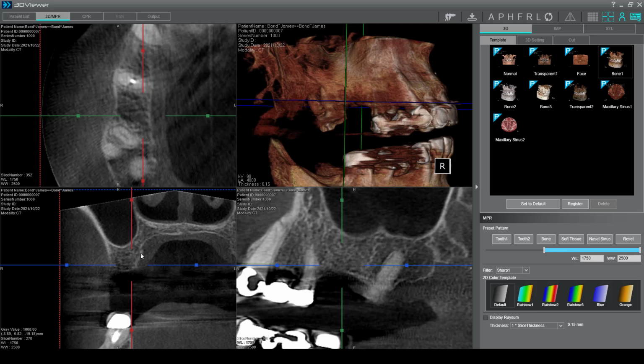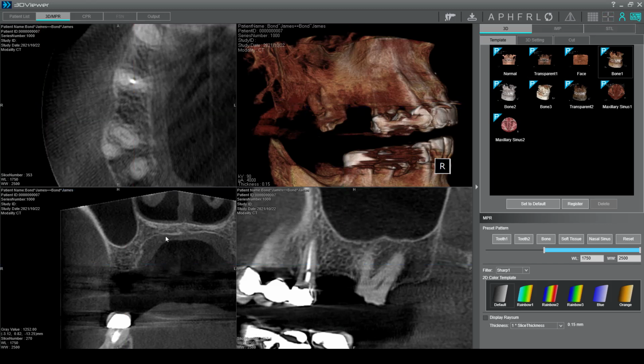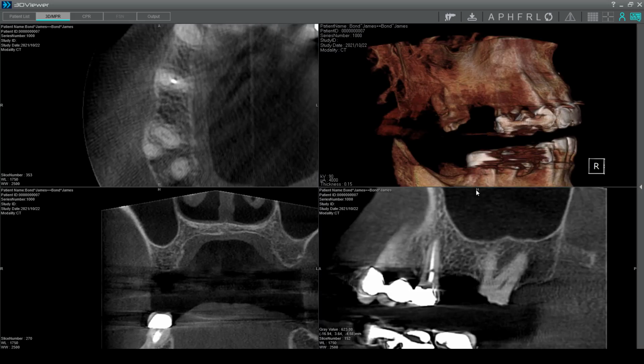So our first and main concern is to get some measurements, just to make sure we have the right tolerances here. Sometimes I like to get rid of the crosshairs, because they can crowd the screen a little bit, as well as minimizing the main window to the right. Okay, so my main focus is right here, taking some measurements. So I'm going to go to my measurement tool here and my line.